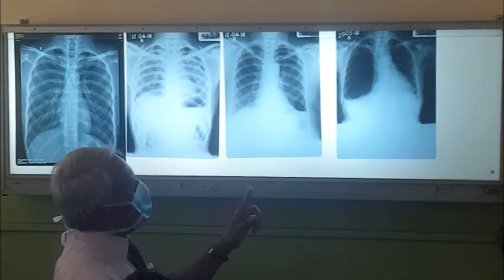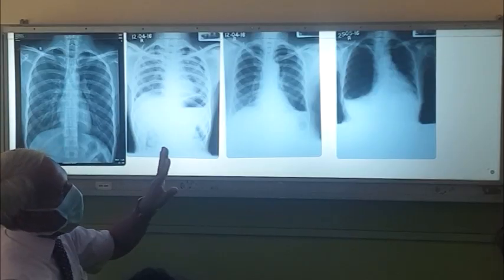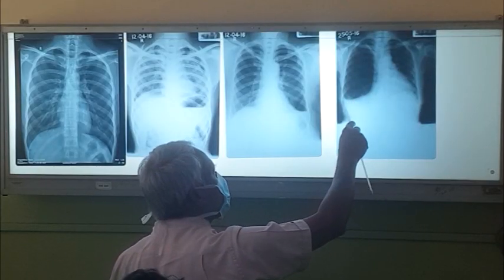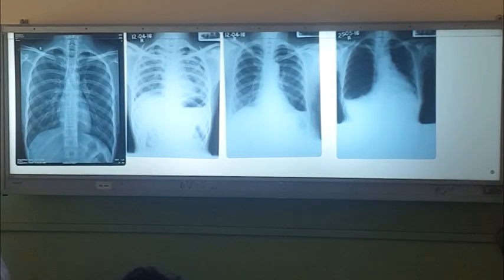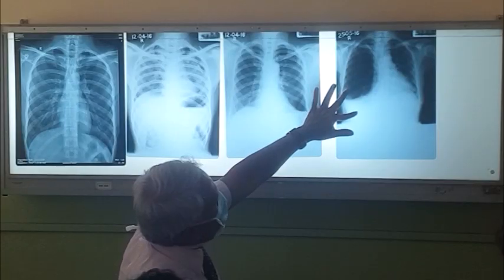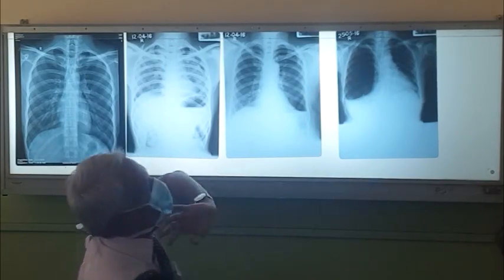Sometimes you find it difficult to differentiate an emphysematous bullous lesion from an encysted pneumothorax. But in pneumothorax, you will see something like this, going like this, right? Encysted pneumothorax, but it is difficult sometimes. But it is very important to differentiate, because if somebody thinks of pneumothorax here and puts an IC tube, this patient is going to die, right?